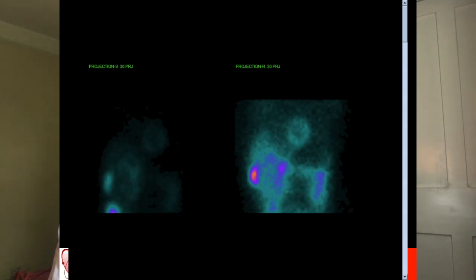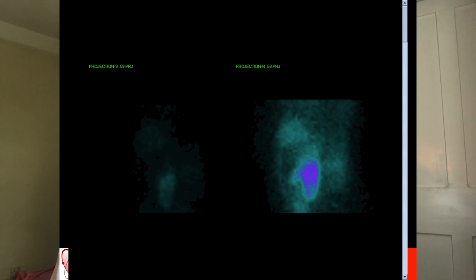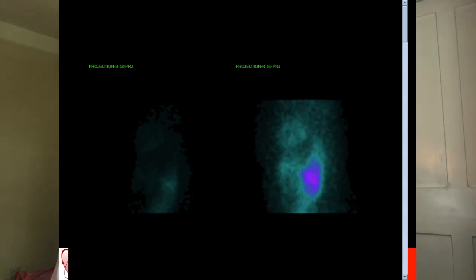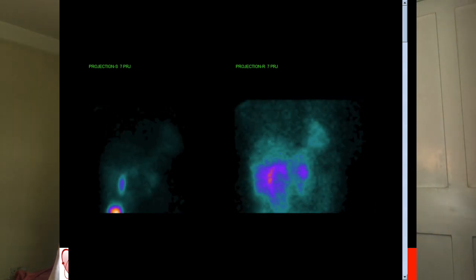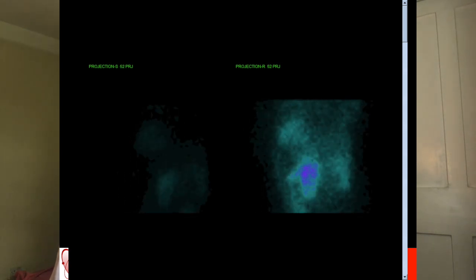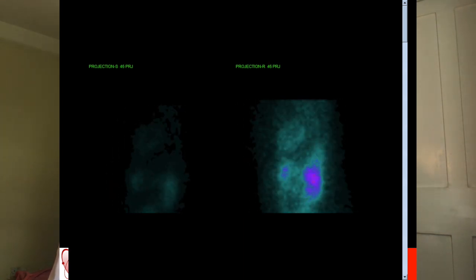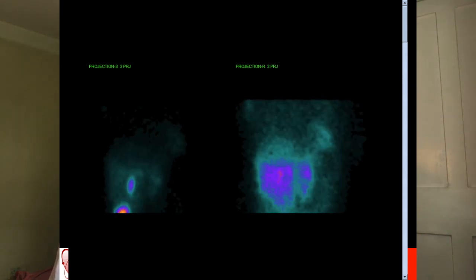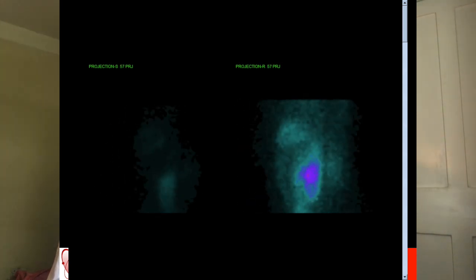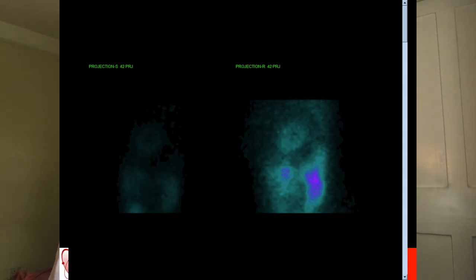Here we can judge for motion. Here we can possibly judge for the size of the patient. We can look for lung uptake, and we can look for adequacy of stress imaging by a reduction of splenic uptake. There's a difference here between the spleen on the stress scan and the spleen on the rest scan, and that variation is due to the splanchnic vasoconstriction you get during adenosine versus myocardial vasodilatation, due to the different receptors that the smooth muscle cells in the respective vasculature have.